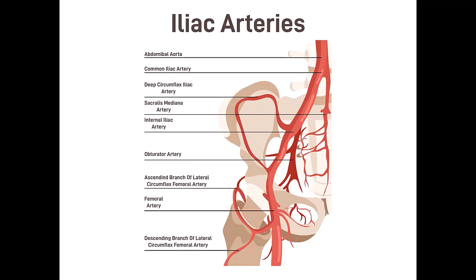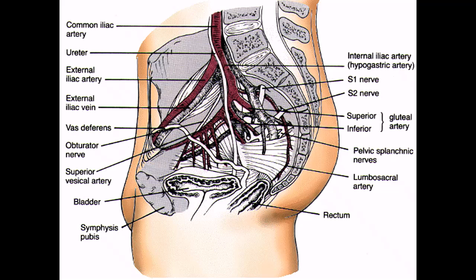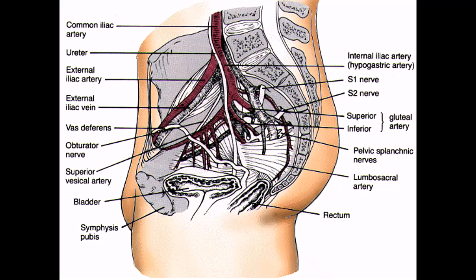Notice in the area we're looking at the iliac arteries, the aorta, and a lot of arterial vasculature. Not only are we looking at the arteries and the venous structure, we're also looking at the ureters, the bony area, and soft tissue area and other organs. You can see why the pelvic fracture is one of the most horrific fractures and one of the ones that needs to be taken care of immediately.